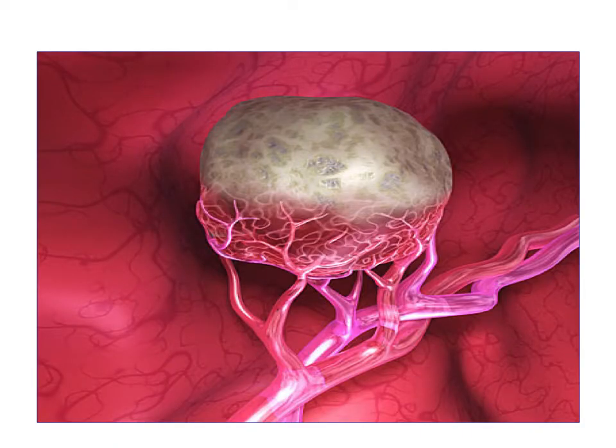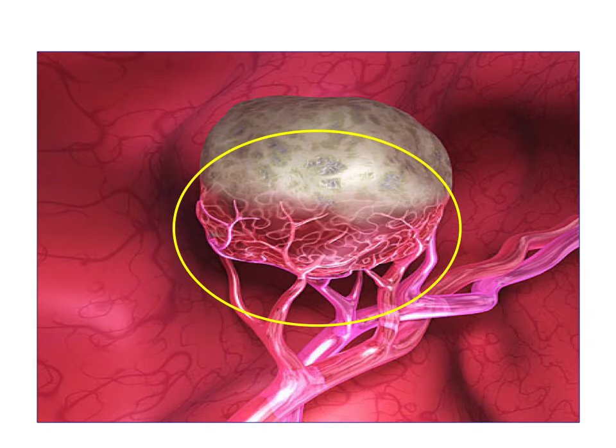The last aspect of the vessels we can observe in squamous cell carcinoma are formed by the neovasculature of the tumor. These neovessels are atypical because they are produced by the host in response to the tumor. And this is why we qualify these vessels as atypical vessels.